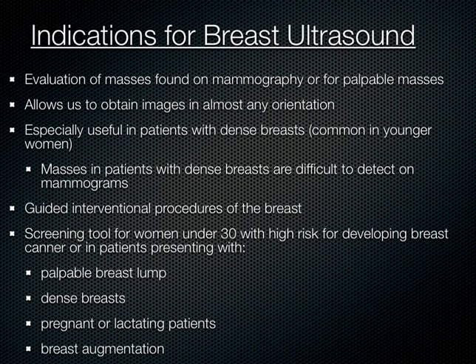And ultrasound is really useful in patients with really dense breasts, which is more common in women who are younger, and also in those dense breasts, masses are more difficult to detect. And another reason to use ultrasound is to guide either drainage procedures, like for an abscess or a cyst, or to guide an aspiration, like a biopsy.